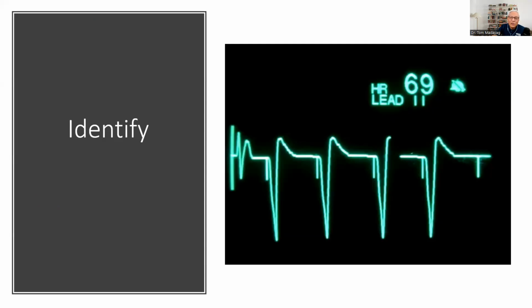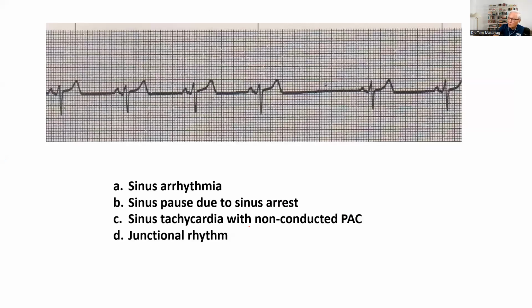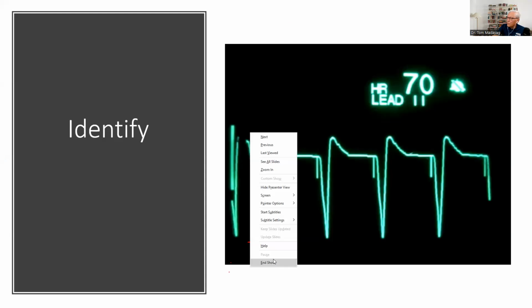Okay, so let's do this. All right, so we have a pacing spike right here. And let me play it again.